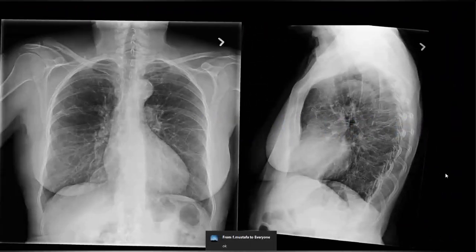Presented with an X-ray chest frontal and lateral projection of a skeletally mature patient, I am able to appreciate a normal cardiac border with a prominent aortic arch with a calcification surrounding it, which doesn't appear to be displaced. The heart appears to be within normal limits.